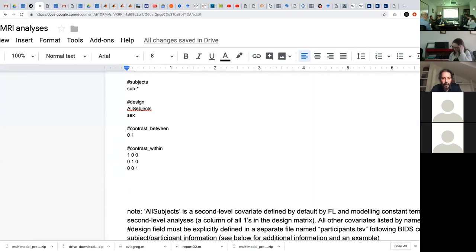When you are looking at that, you can then enter the contrast here, and by looking at the direction of the contrast you specify, it's going to tell you whether a positive means higher for females or higher for males. In this case, a positive means higher for females because you are assigning a 1 for females and a -1 for males, right? And if you do it the other way around and enter something like that, then a positive means higher for males. Make sense?